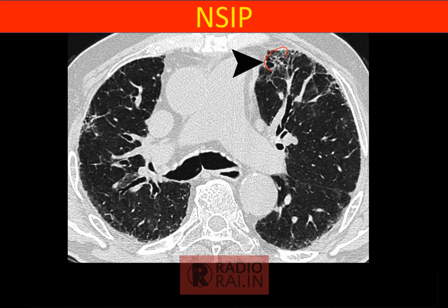So again, we can see more of a reticular type. It almost resembles the honeycombing, but honeycombing will have clear cystic spaces with thick septations, which will look like a honeycomb appearance. So this looks like few cysts are having proper septations, others are not, so they are not actually having proper overlap. Whenever I say honeycombing, it should have at least 3 layers of cysts which are sharing their walls. Okay, so that's how we call UIP. So this is again a fibrotic type of NSIP.